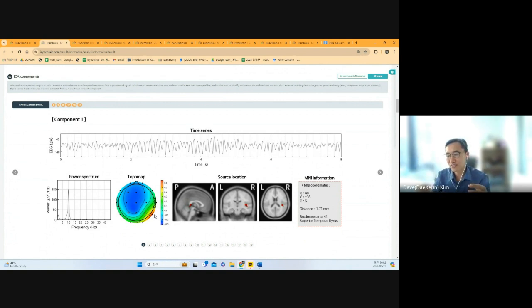That's the depression. Alpha activity should be in the posterior visual cortex area, but in depression, the alpha activity is diffused in the anterior direction. And finally, the frontal alpha is dominant. That is the typical depression pattern.